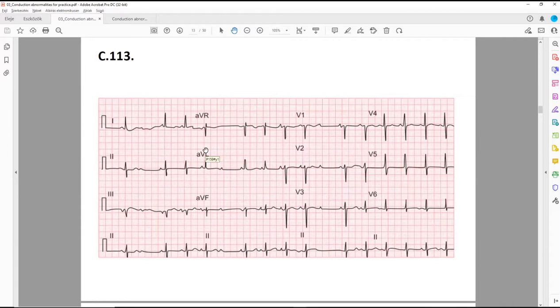13? Yes, this is mine. Okay, so first I see it's arrhythmic. Heart rate: I counted 6 seconds with 7 peaks, 7 R, so about 70. For the axis, I see lead number 2 is equiphasic. So the perpendicular to that is AVL, so around minus 30 degrees, but still in the normal axis.